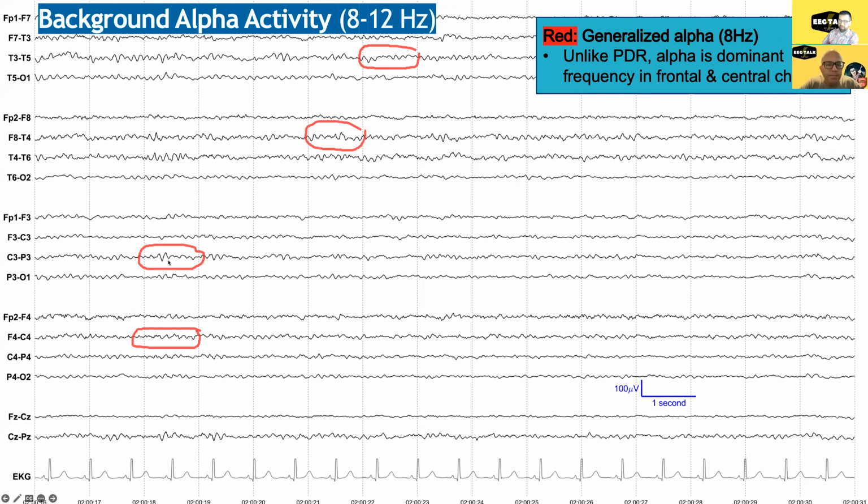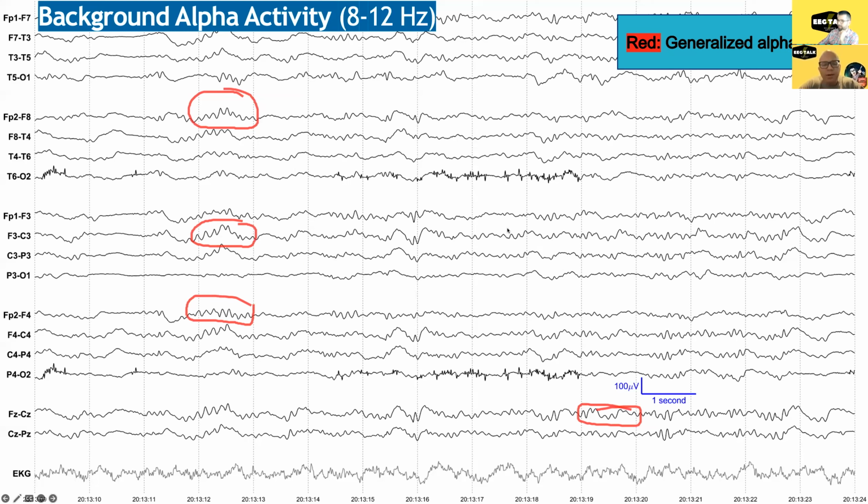I think this alpha kind of comes and goes a little bit, right? It's there in the circles, then it's attenuated, and then it comes back, and it's attenuated, comes back. I think this is probably a person receiving a sedative drug like propofol. Got it. Which causes both the slowing and that alpha activity together. Gotcha. All right. Cool.